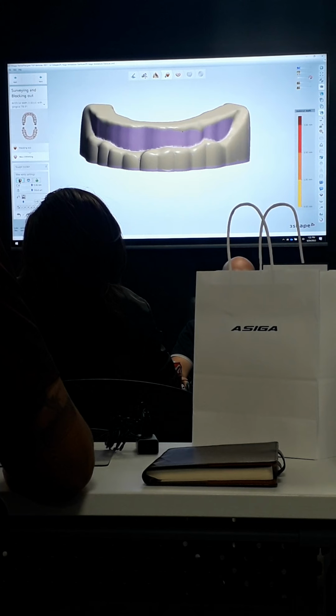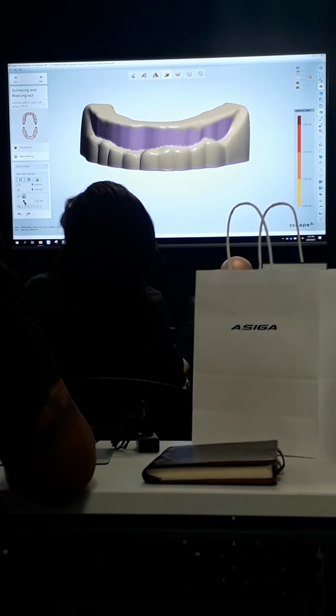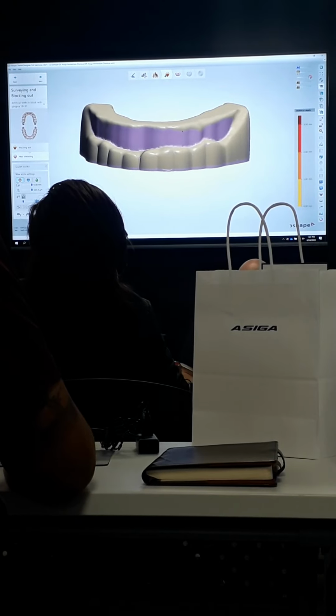So you'll see when I'm on the add tool here, and I come down below, this slider here is your circle size, how big the circle is. And then the one below that is how much it adds or takes away depending on which tool you're on. But then I have this other slider down below here. One of the things this slider will do is you can put a value in this box here, and then whatever that value is, that's what the software is going to stop you at.